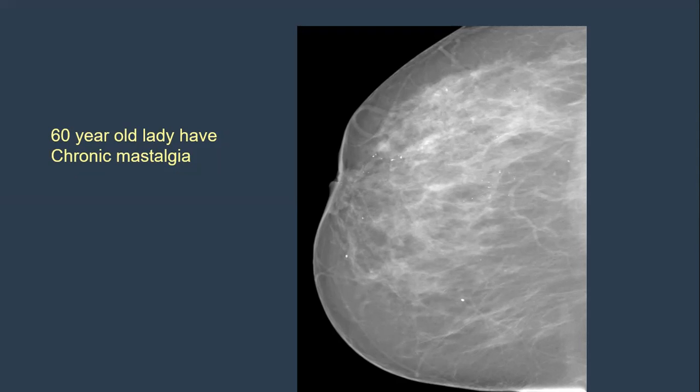And these are ductal calcifications, not very clear, but they are ductal calcifications. What do they signify? Are these ductal calcifications benign or malignant? Rod-like, some with lucent center, some faint, small rod-like. Plasma cell mastitis. It is plasma cell mastitis.